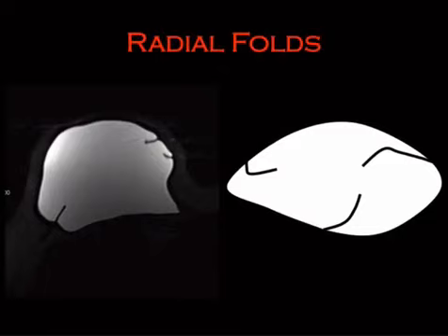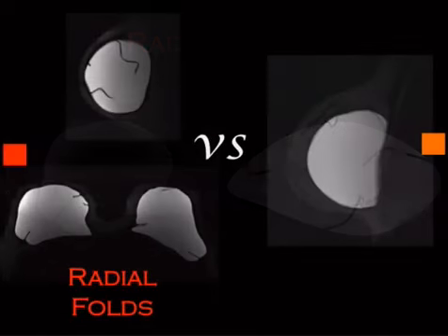This was our red case. And this is what's called a radial fold. The reason it matters is because it's a mimic for intracapsular rupture for people that haven't looked at a lot of breast MR for implant rupture. It's the most common trickery with regard to trying to get you to say that there's intracapsular rupture. But it's not.